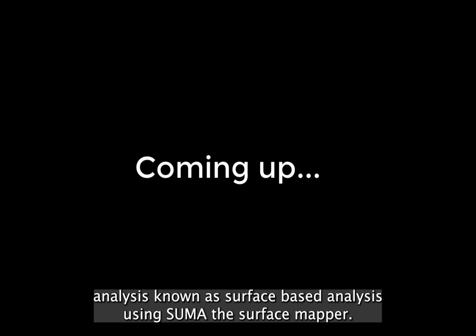Now that you've completed most of the analyses you would do with a typical fMRI dataset, we will move forward to a more advanced analysis known as surface-based analysis using SUMA, the surface mapper.